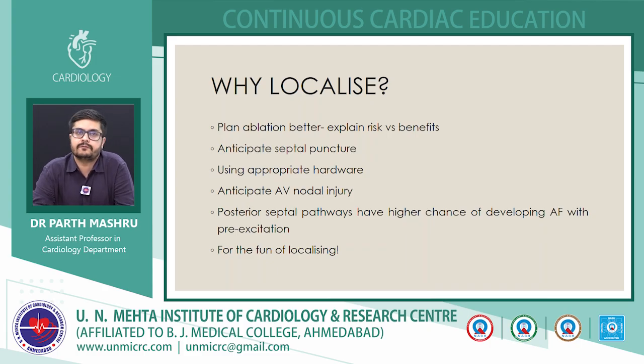And of course, for the fun of localizing, for example, if you are seeing a WPW patient in OPD and you have localized the pathway according to your logic, and then electrophysiology is planned, and if the same pathway comes out to be true, it will be fun. It will be the most satisfactory thing.